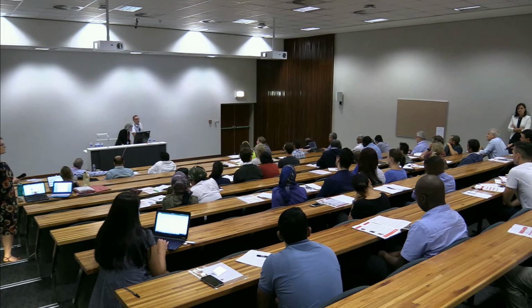In a woman who's had an endometrial ablation, subsequent scanning, what is normal and what's abnormal? Sometimes I see women in their perimenopausal ages who previously had an ablation, and now you see fluid levels within the uterus, and you see what looks like active endometrium. What should you accept in the perimenopausal woman as normal and abnormal in the ones that had ablations?